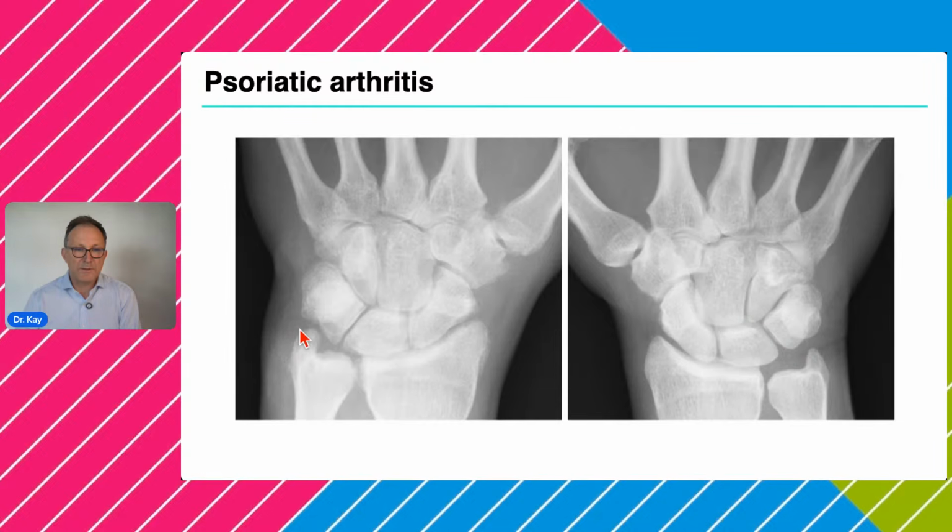And here you see the periosteal new bone formation with ill-defined cortex, with fluffy contours, with periosteal new bone formations at many parts. And I think this is also now the point where we go over to our interactive cases.